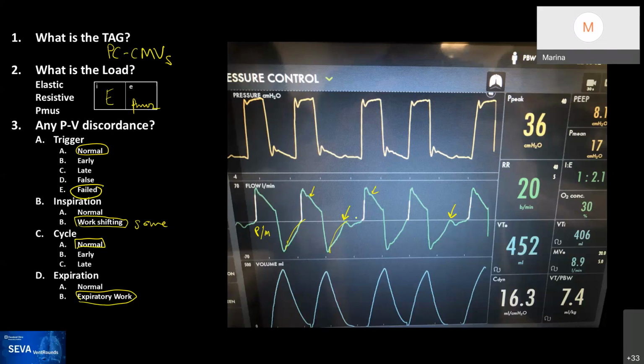Yeah. So a key thing: if this is a patient-triggered breath, this could not be an early trigger, because it was triggered by the patient. Does that make sense, Mike? I'm having a hard time differentiating what would be a patient trigger versus an auto trigger, since the ventilator would interpret both as coming from the patient. Exactly, that's the key here. You cannot make that difference from looking at this waveform, of what is a false trigger and what is not. I'll show the next waveform in a second.